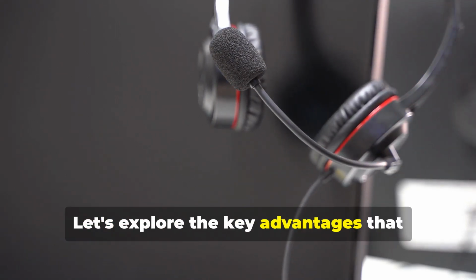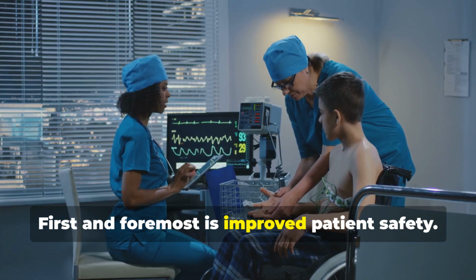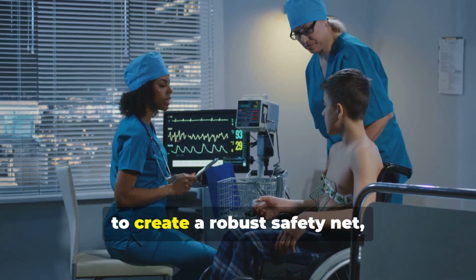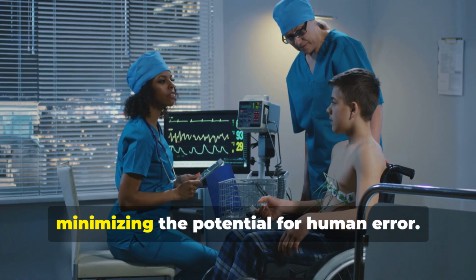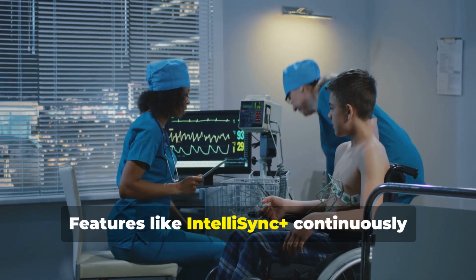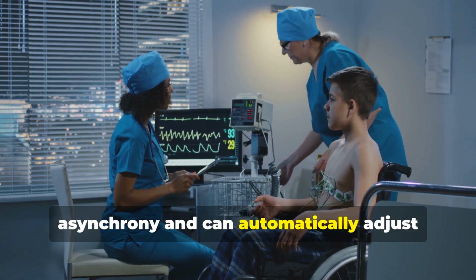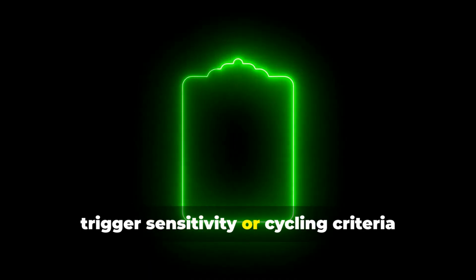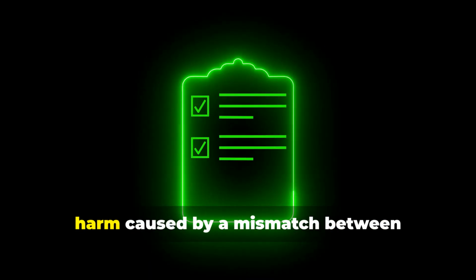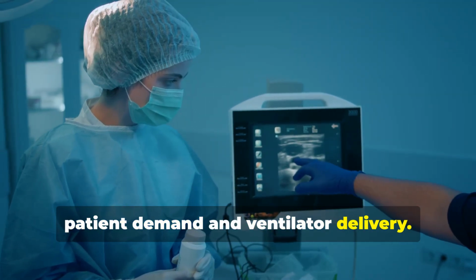Let's explore the key advantages that set the G5 apart. First and foremost is improved patient safety. The G5 leverages intelligent automation to create a robust safety net, minimizing the potential for human error. Features like IntelliSync Plus continuously monitor for patient ventilator asynchrony and can automatically adjust trigger sensitivity or cycling criteria to resolve it, preventing the distress and potential harm caused by a mismatch between patient demand and ventilator delivery.